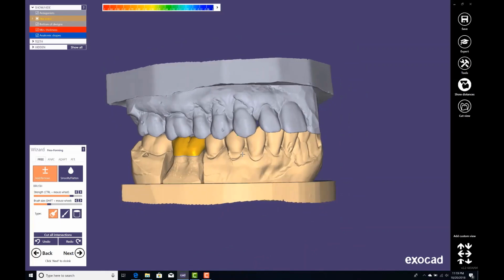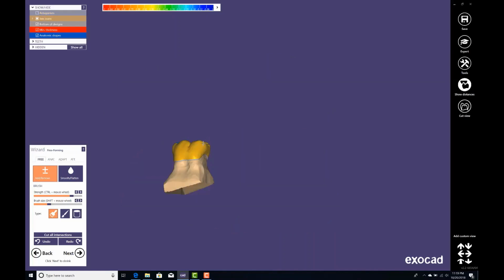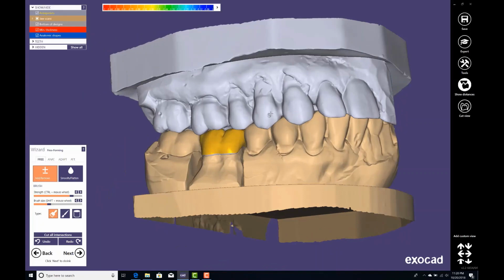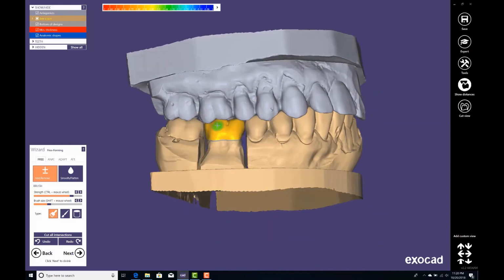So I'm going to give you another example. Let's say I want to take off upper, lower and crown. So control wheel on upper, control wheel on lower, control wheel on the crown. As you can see, I took off three of them. Now if I want to bring them back, I click control shift and the wheel, 1, 2, 3, and they come back in sequence. So it's a pretty cool hotkey. It makes your life much easier when you start to work on really big cases.